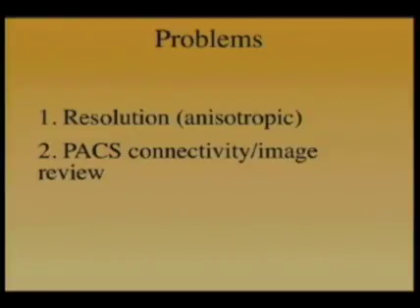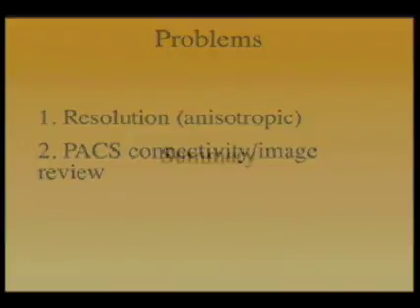Now, you can take the 3D data set and create static images, and you can create those volume views that I showed you and send those to PACS. But all the interaction with the 3D volume, which is really essential to getting all the information that you need out of it, has to happen on a dedicated workstation for right now. And I think that will eventually have to change.